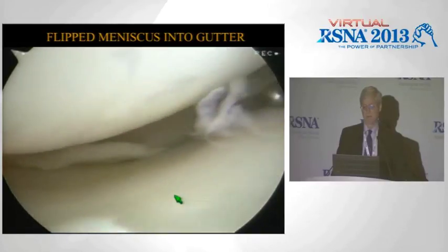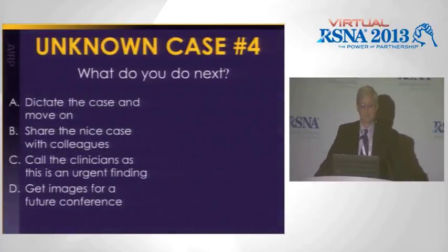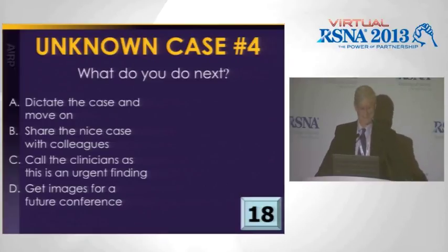Right there. Very nice. So, last question here. What do you do next? Dictate the case and move on. Share the nice case with your colleagues. Call the clinicians as this is an urgent finding. Get images for a future conference. All of the above. Right? Oh, now I've got the clock.